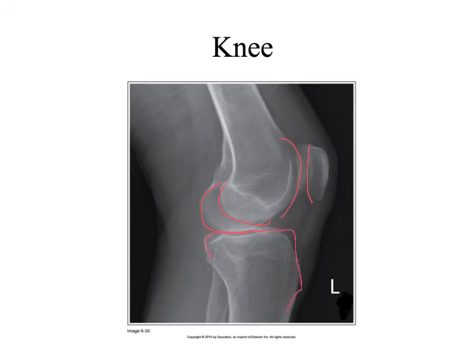Right? This image is more or less centered appropriately. It may be a little bit low, but not much. I mean, centering wise, it may be a little bit high. But so that's the stuff we're looking for.